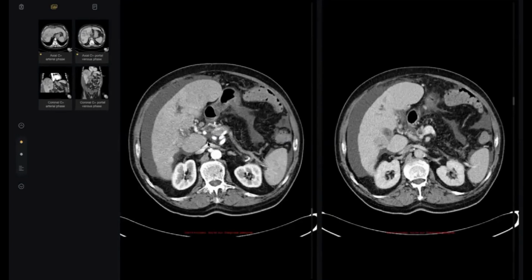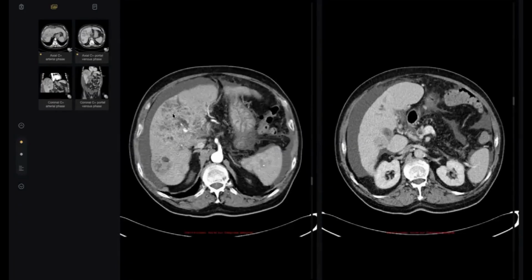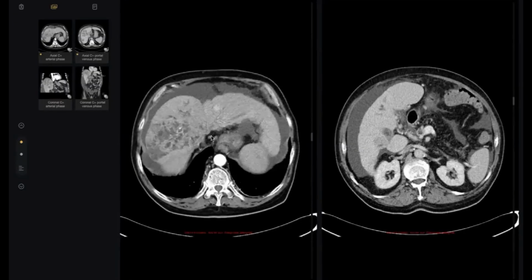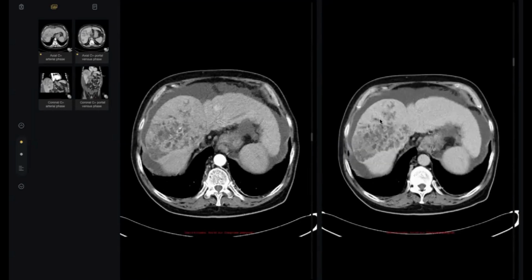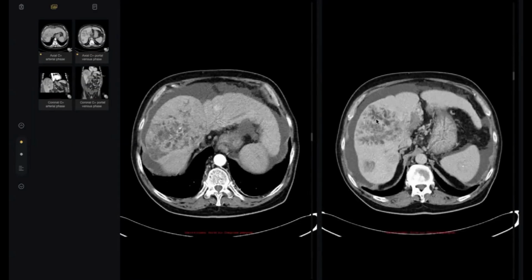The most important is this other one. What happened? This large infiltrative HCC infiltrates the main portal vein and its main branches. Very important. This lesion can be classified as LI-RADS tumor in vein. By the way, this is the worst classification. Why? Because this patient is end stage and not eligible for liver transplantation. Very bad situation, so it is very important.